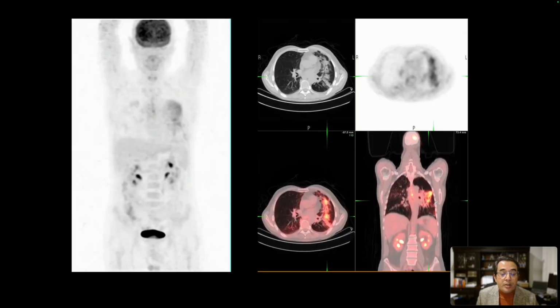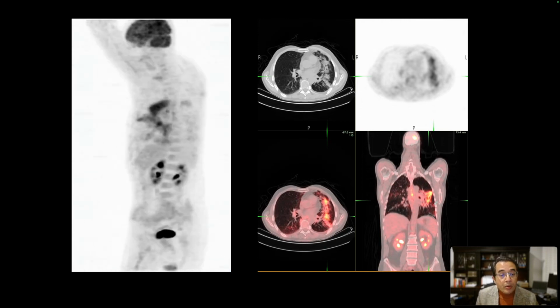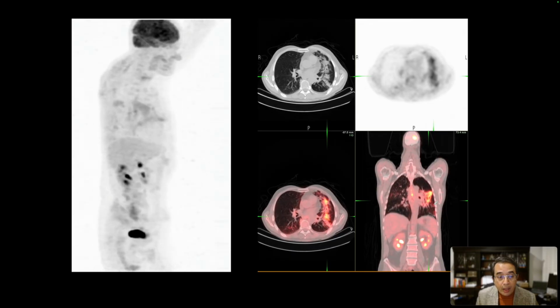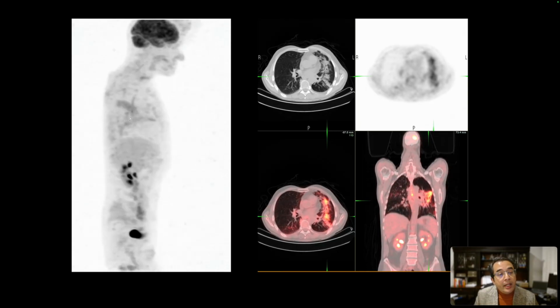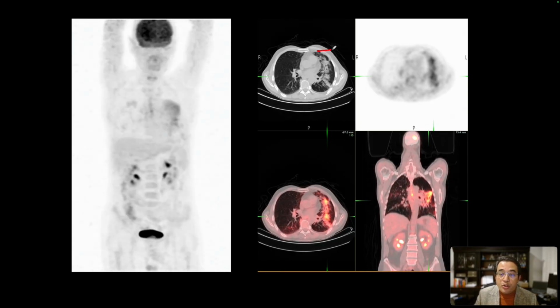Here's our next patient. They were evaluated for recurrent or residual lung cancer post chemoradiation, and we see this band-like intense FDG uptake that corresponds to these opacities with a linear border in the left lung. And this finding is characteristic of post-radiation pneumonitis and not residual disease or recurrent cancer. This has to be recognized on FDG PET CT studies and reported as such.